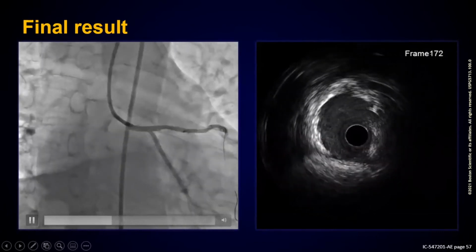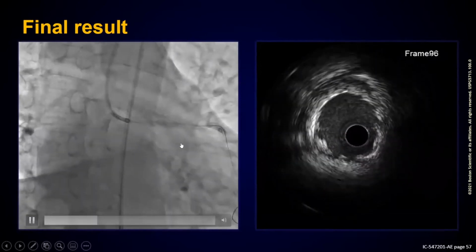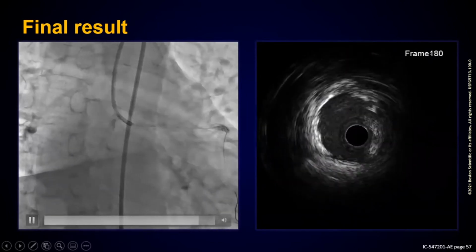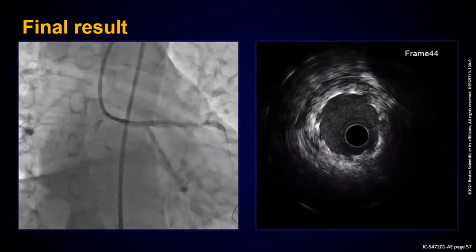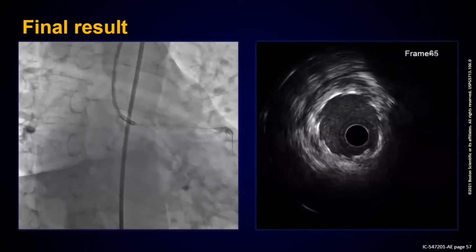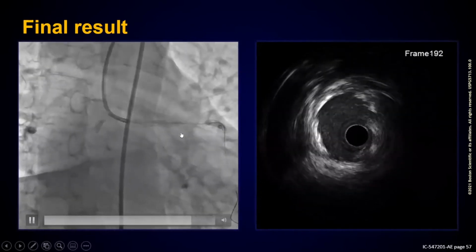This is slightly higher in terms of accepted area than what we see from the Korean data, which came out a few years ago. But two important things: optimization of the stent to the vessel wall, and increased area to reduce your risk of restenosis.